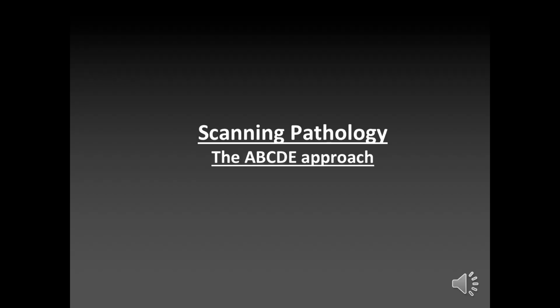Now going on to how you actually look for problems. I think this is fairly simple to get a beginner's grasp of, but it'll be incredibly difficult to actually pick out pathology, and you'll always second guess yourself. Whenever I see it, I just shove it in front of the consultant and ask them to confirm whatever it is.